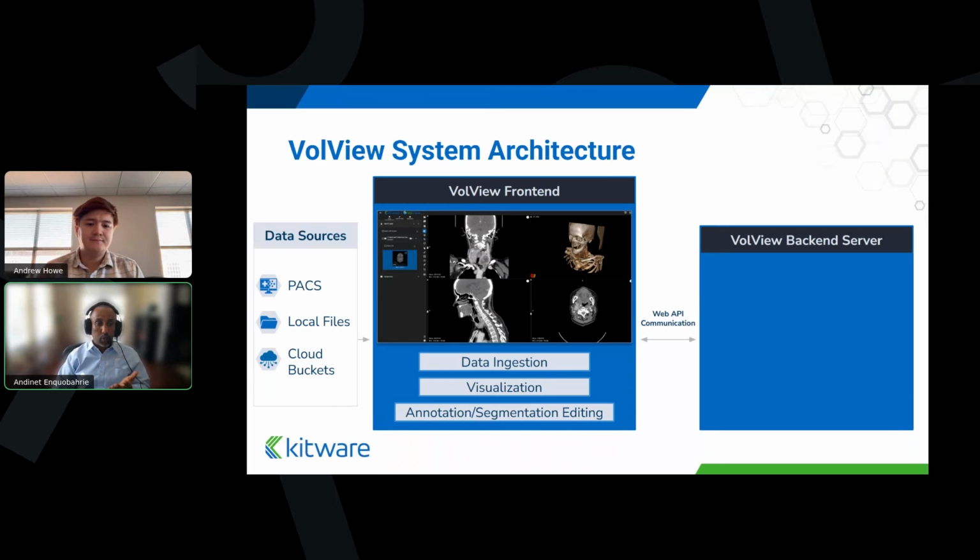And then we will show how we're going to use VolView's backend server architecture to run those AI services that are made possible using NVIDIA's Clara open source models.